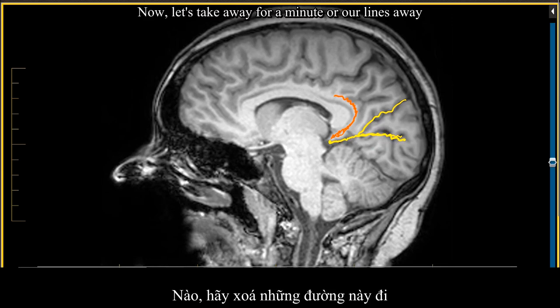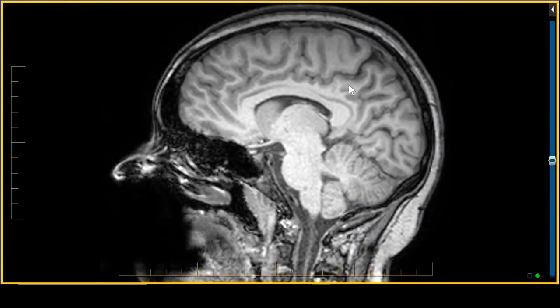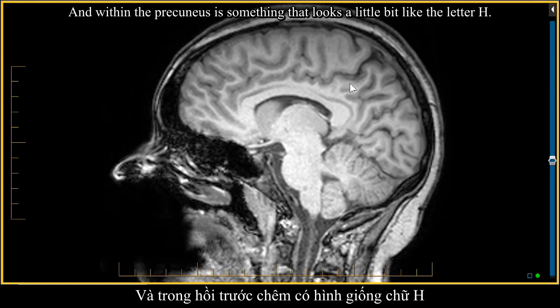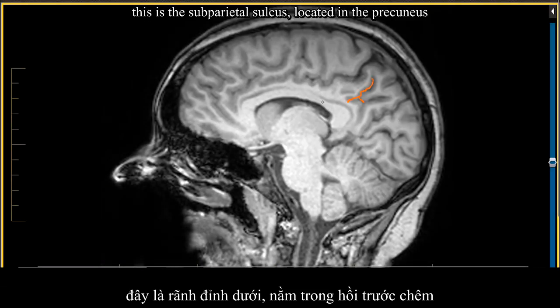Now let's take our lines away for a minute. We've got the occipital lobe and the cuneus. In front of that is the precuneus. And within the precuneus is something that looks a little bit like the letter H. There's our H. And this is the subparietal sulcus, located in the precuneus.